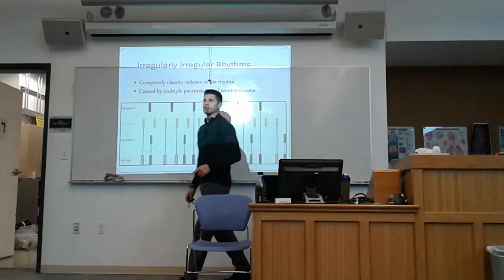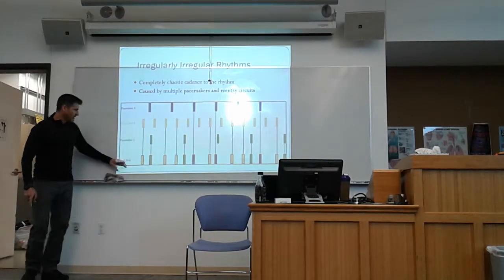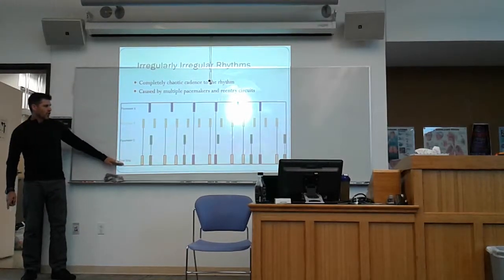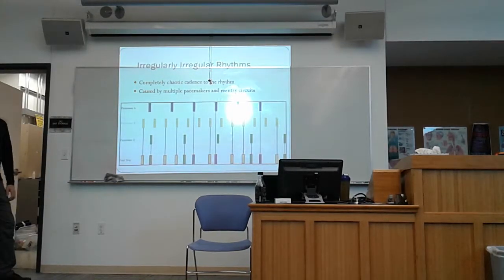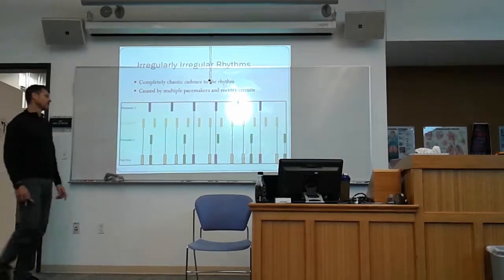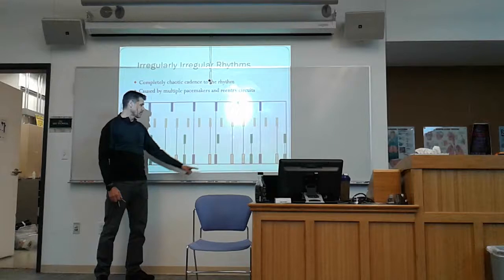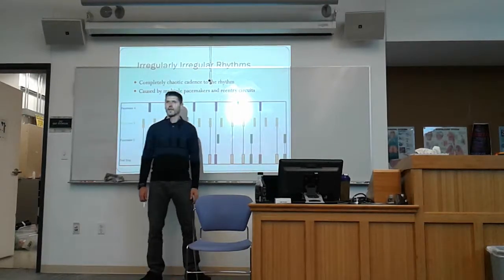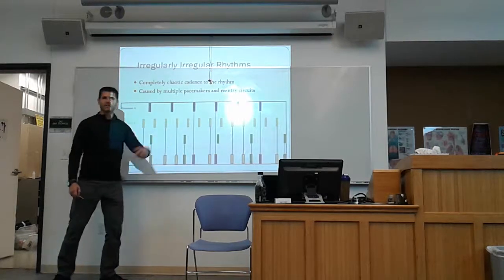That's different than one that has no pattern to it. So look only at this strip for right now. We're looking down at this strip, and you can't see a pattern to it. There's no pattern to it. You go, oh, wait a minute, Cory, because there's 2 yellows, a green, and a blue, and there's 2 yellows, and a green, and a blue. Fine, but it's interspersed by a yellow, blue, and a yellow, green. That's not a pattern. That's coincidence that those 2 came together, but the other ones are different.